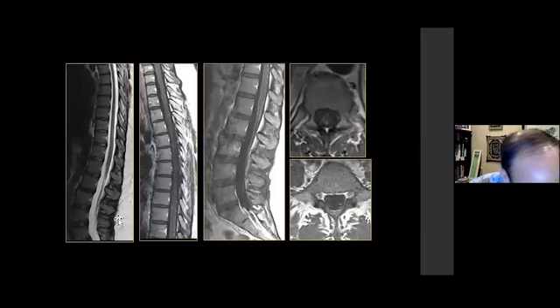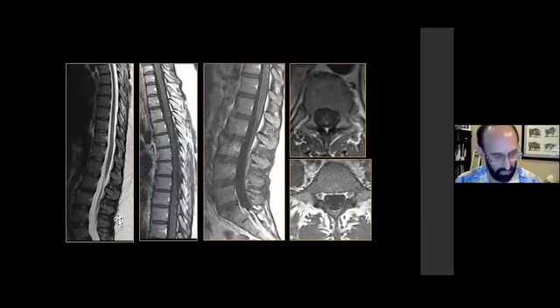This patient presented with beta thalassemia and obesity, presented with acute sensory loss in the perineum and legs, had problems urinating, could feel the urge to go, but only a trickle would come out, and developed numbness and tingling over her perineum. So the T2 weighted scan looked pretty much unremarkable.